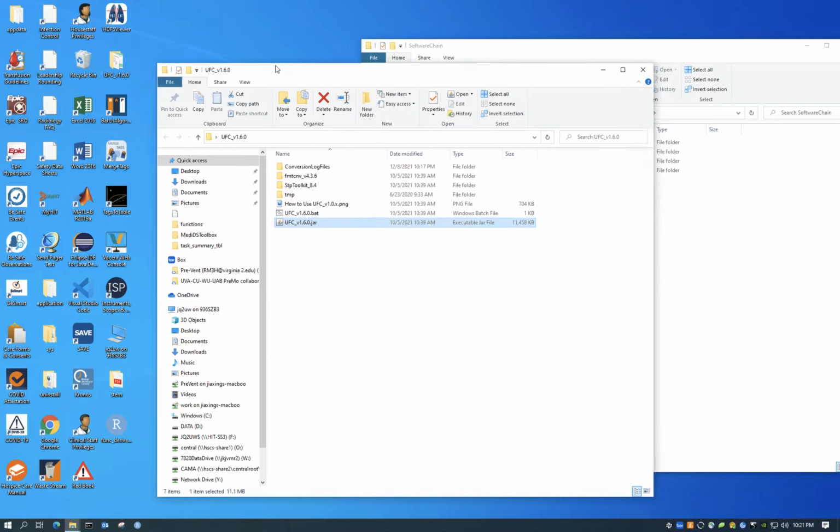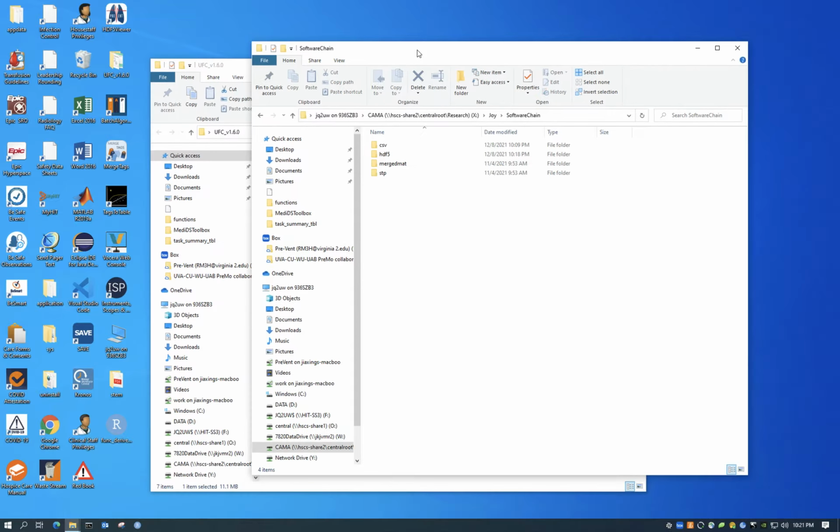Okay. So in this tutorial, I am going to walk you through one example of how one example file has been converted from STP, which is one of the formats collected from monitoring data, to HDF5. HDF5 files are the format that will be input into batch algorithm processor, and we can then do calculations to get meaningful event tags or statistics of those vital signs or waveforms from the HDF5 files.